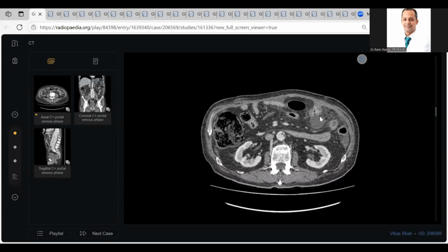Final diagnosis in this case, with the history of anastomotic clips, could be anastomotic dehiscence, causing contents of the small bowel to be in the free intraperitoneal space, which is concerning. This is an urgent surgical review. They may need a washout of the abdomen, and they may need to go in and review the anastomotic suture clips. Thank you, doctor.